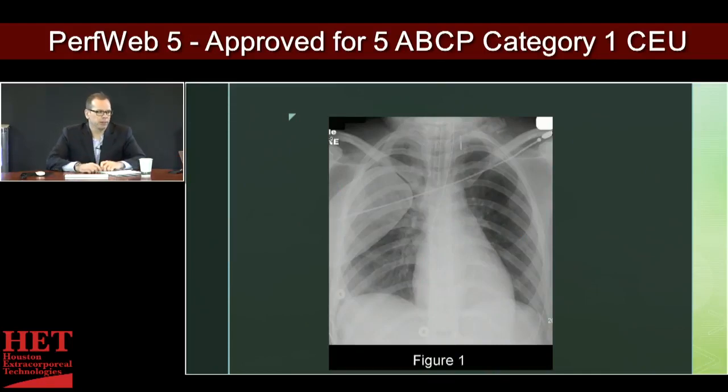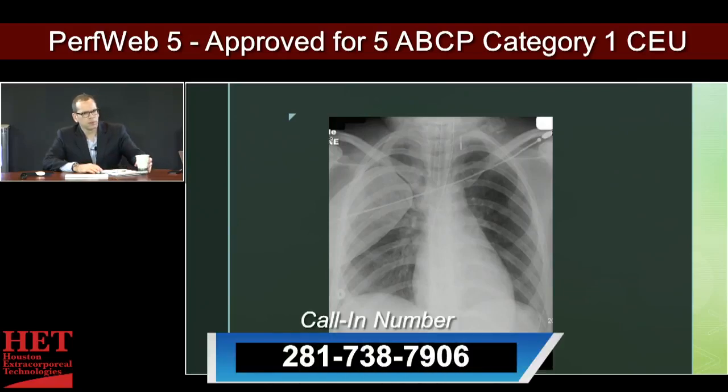This would be a great call-in film if anybody's able or available to call in. Describe what you see here. This is worth bonus points. People don't like to call. They get nervous.